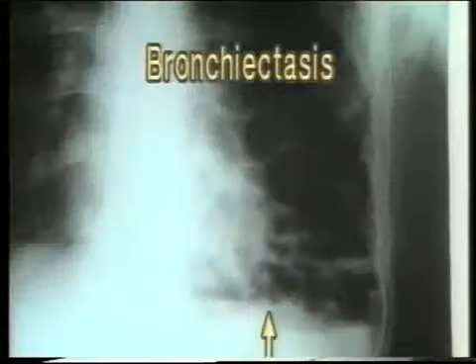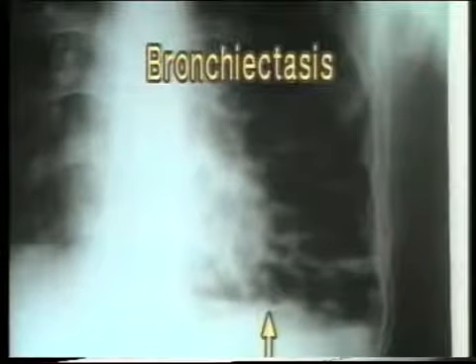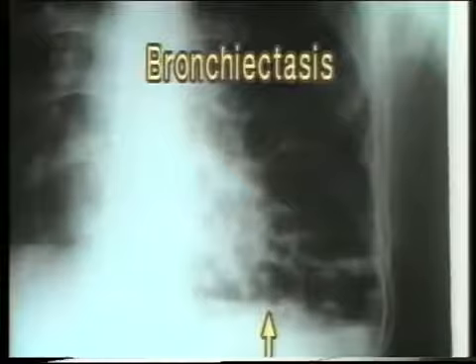The cysts in dependent areas shown by the arrow contain a fluid level indicating retained bronchial secretions. A definitive diagnosis can, however, be made only on bronchography.